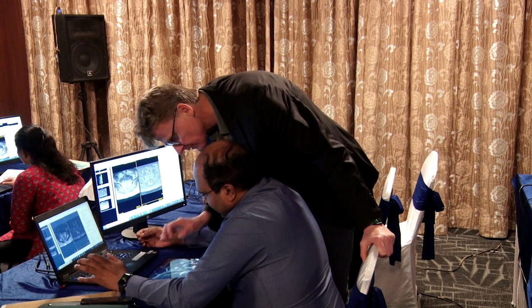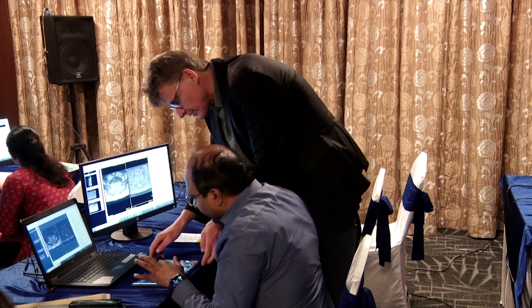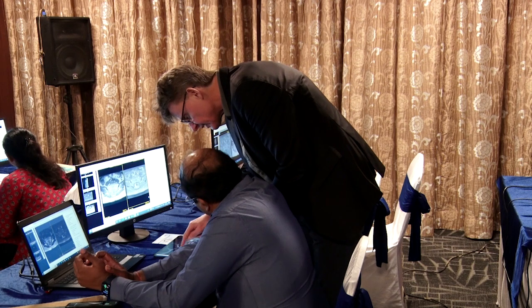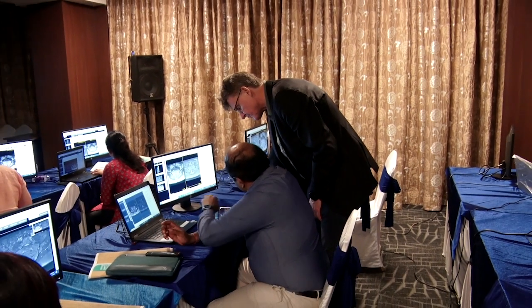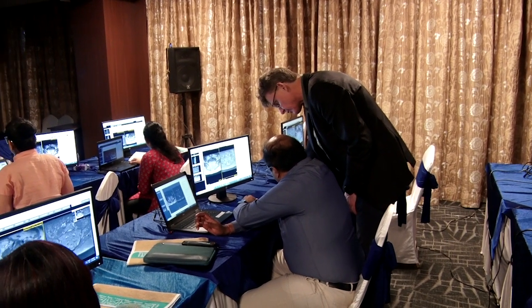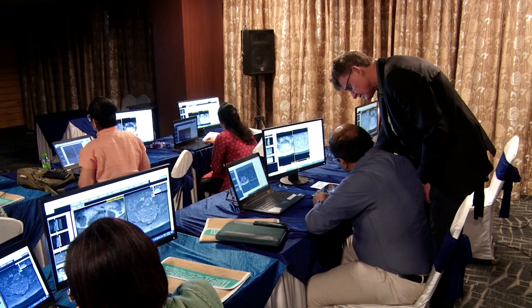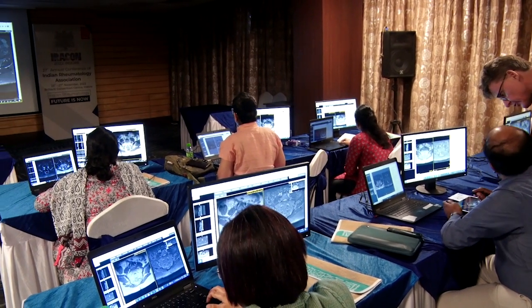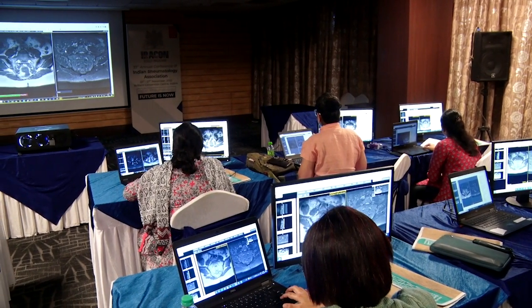See now, if you look at that, is it erosion or is it just irregular? Yes, but what is this thing here? Where is the joint space? The joint space is correct, from there to there. But is it erosion?